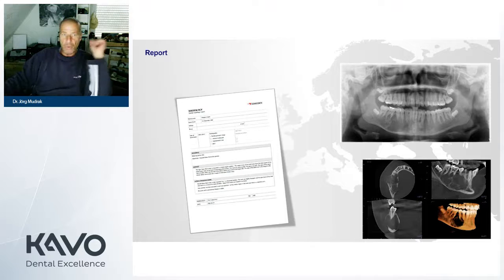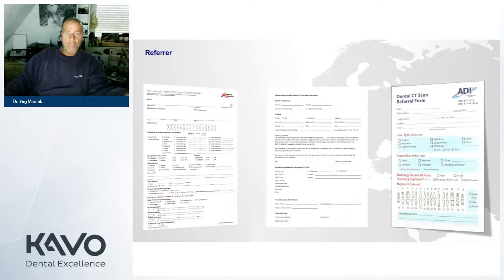All right, so for all the work we have done, we have to do some kind of documentation. It's mandatory to do some documentation that can be custom made, or the software gives you the option to do this, where a program is integrated, for example.